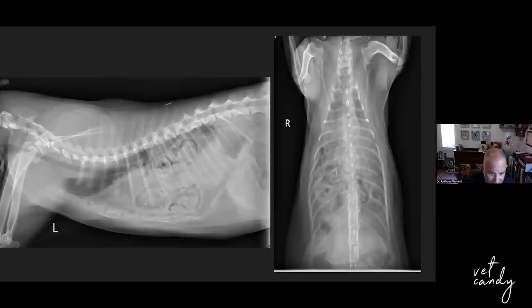These are gas-filled loops of small intestine, a combination of fat and soft tissue, likely representing any old abdominal organ and some abdominal or mediastinal fat. So this guy has a diaphragmatic hernia. It's so extensive, it's really hard to figure out what caused it. I would guess that it's probably from trauma that he has this hernia. Cool.